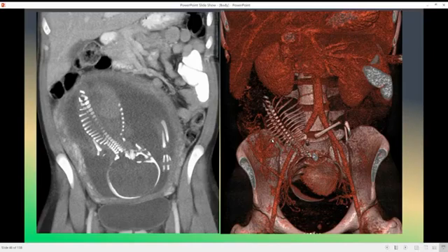This is not a pseudocyst. This is walled-off necrosis, walled-off collection. This is due to necrotizing pancreatitis. This is the terminology used with the Atlanta classification 2012. Okay, what do you think about this case?